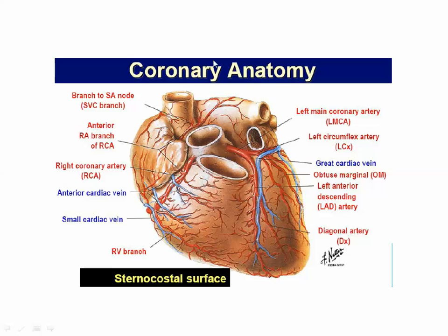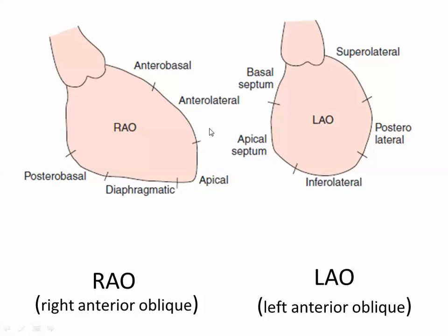Posterior to it is the aorta. Yes? So the pulmonary will be here. So if you see a vessel coming outside the border of the heart going to here, what would it be? It's a fistula. It is a coronary pulmonary fistula. Okay? So once you know the anatomy, you will recognize an abnormality. It's clear?